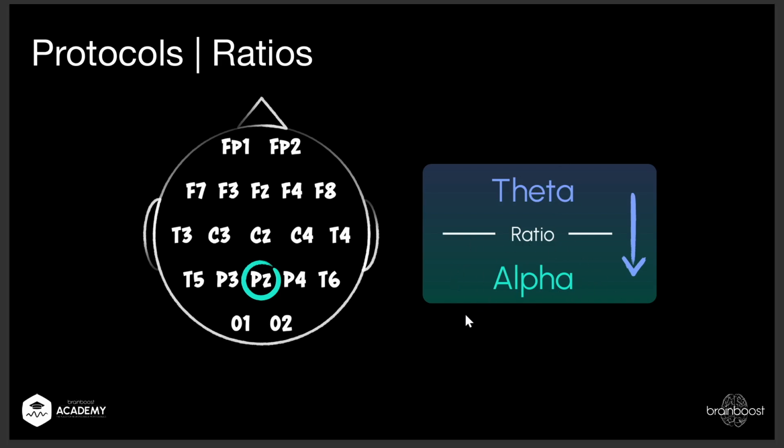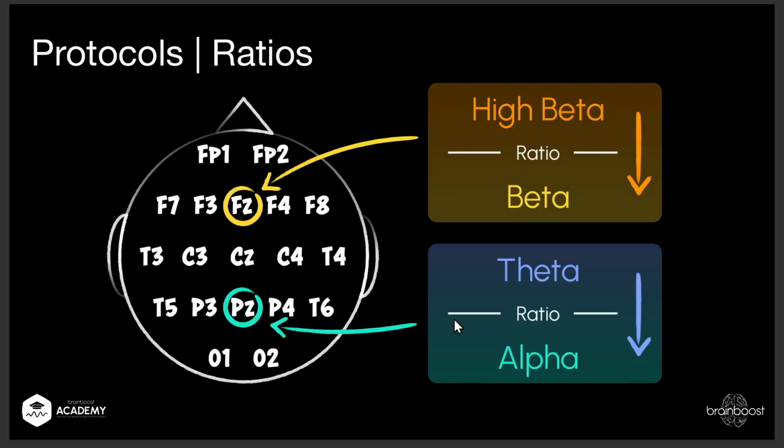Just stay in alpha mode. Or, now let's get super crazy. Some people say, I want to train on multiple positions, different ratios. So you kind of see, I'm going the way, hey, ratios would be pretty cool. So yes, we hear you and we're always happy about your feedback. So let's check. What can we do now?